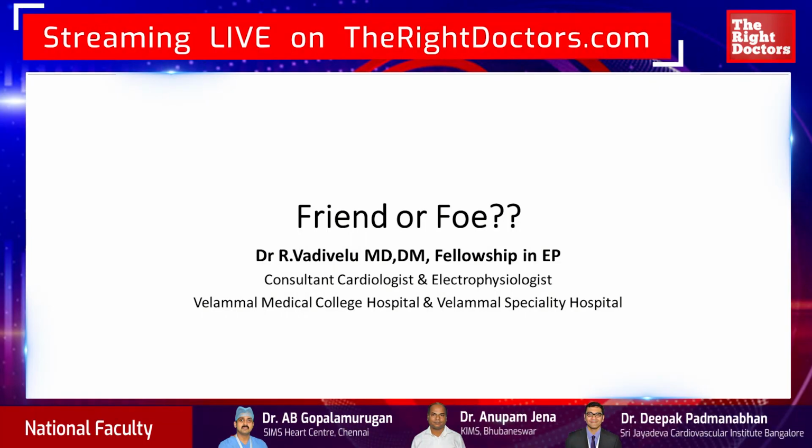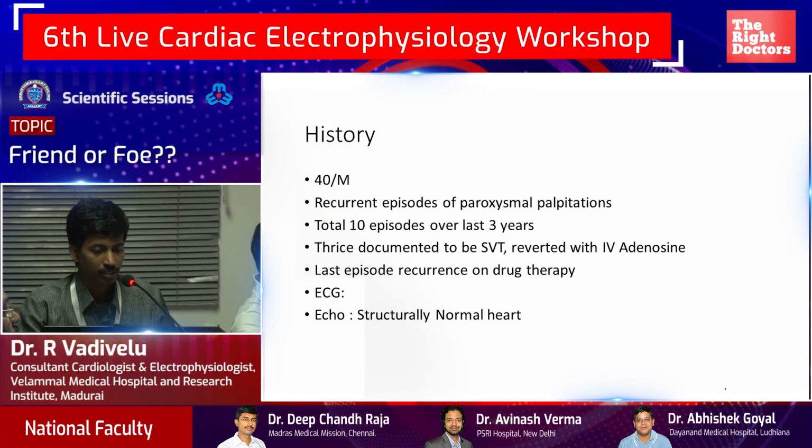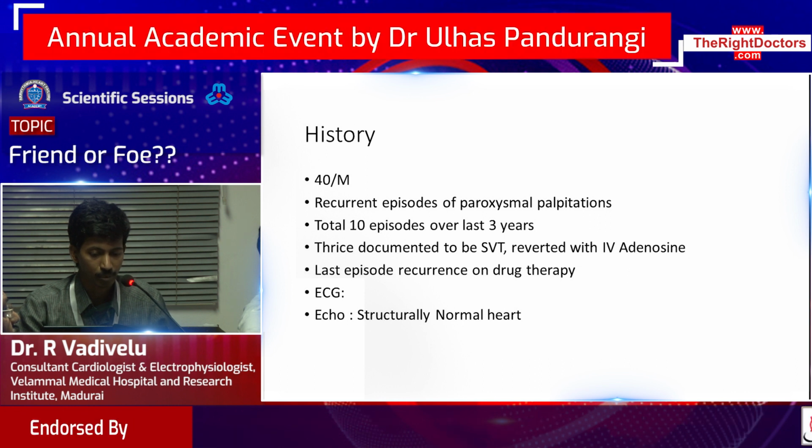Today I'll be presenting a very straightforward case. The point of interest is to show one of the very interesting potentials, and how to differentiate it from the normal bundle potential. So basically, a 40-year-old gentleman presenting with recurrent episodes of SVT despite being on drug therapy.